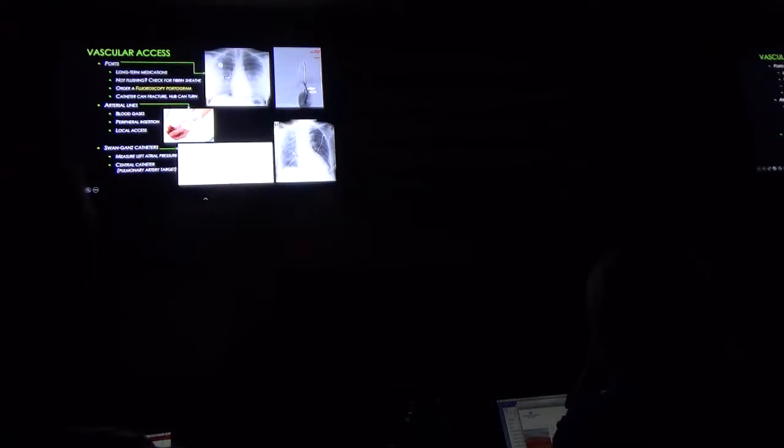it. And again, I did not do internal medicine, nor was I ever practicing in a hospital within the city, so I guess that's what this is. So I don't even know how to identify it. It's going down and then going across and over into the right pulmonary artery. So that's what these arrows are indicating. You see that?